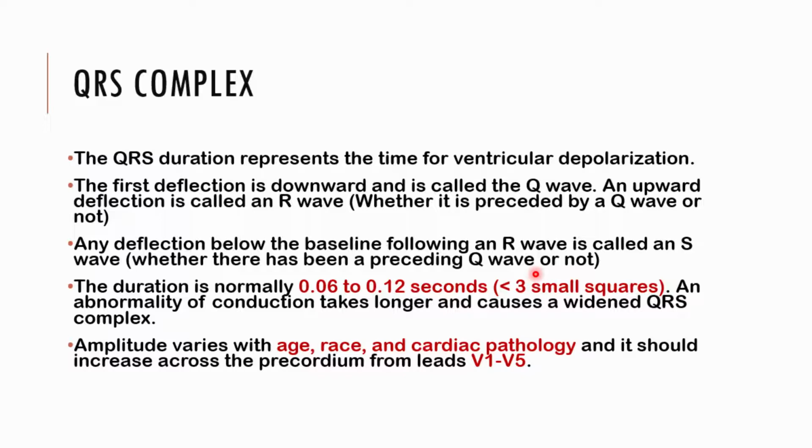If you realize, most of these things are going to be less than 5 squares. So that's the rule of thumb. Most of them are less than 5 squares. So if you are going past 5 squares, then that's a very significant thing. And for you to actually reach 5 squares, it will be very easy for you to notice. So take note of that.